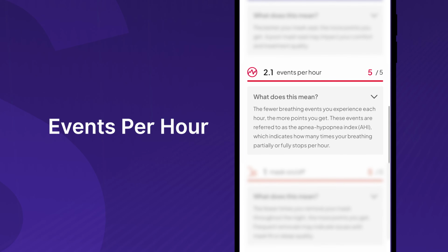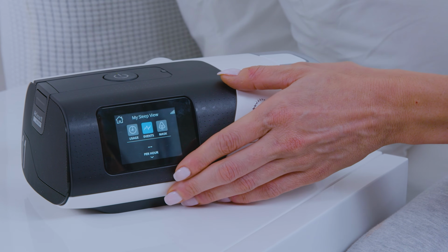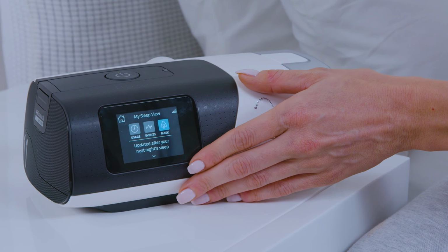Breathing events per hour. This refers to how many breathing interruptions you had per hour. Fewer events equals better sleep, which equals more points. If your machine detects lots of events, you'll lose points and get suggestions how to improve. You don't need to memorize what AHI is. The app simplifies it for you. Lower number equals better score.